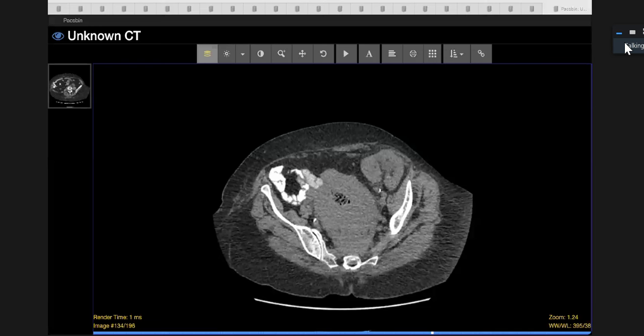It doesn't grow in like an adenocarcinoma causing obstruction. It kind of grows out, and it's massive, isn't it? So this is PTLD, and you did really well with that case.